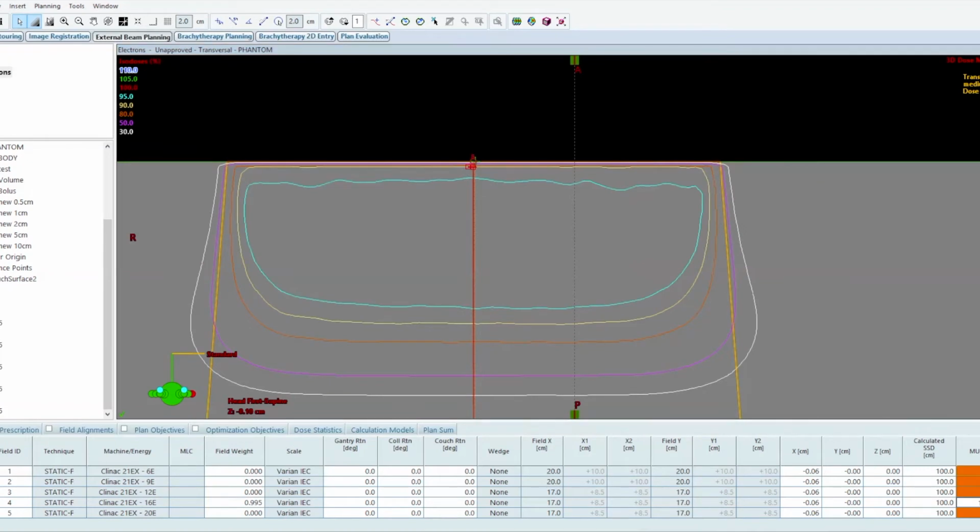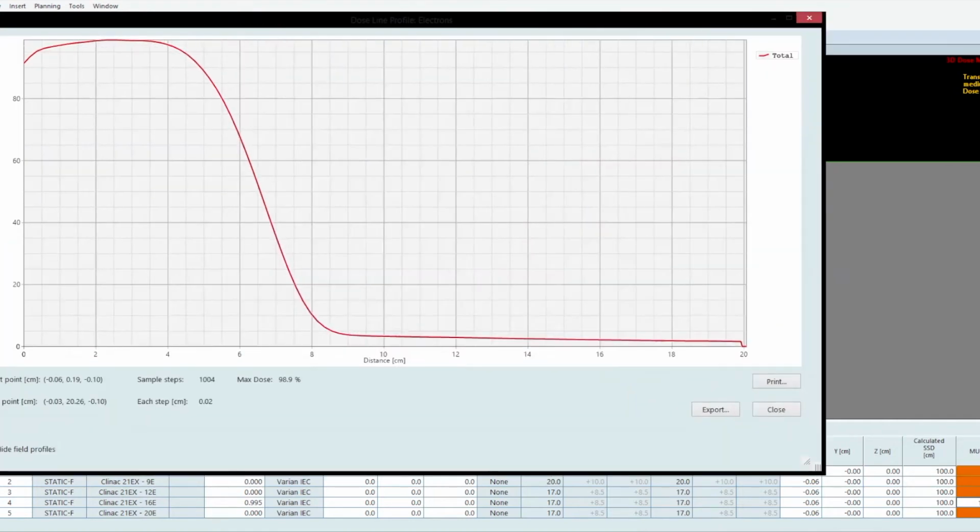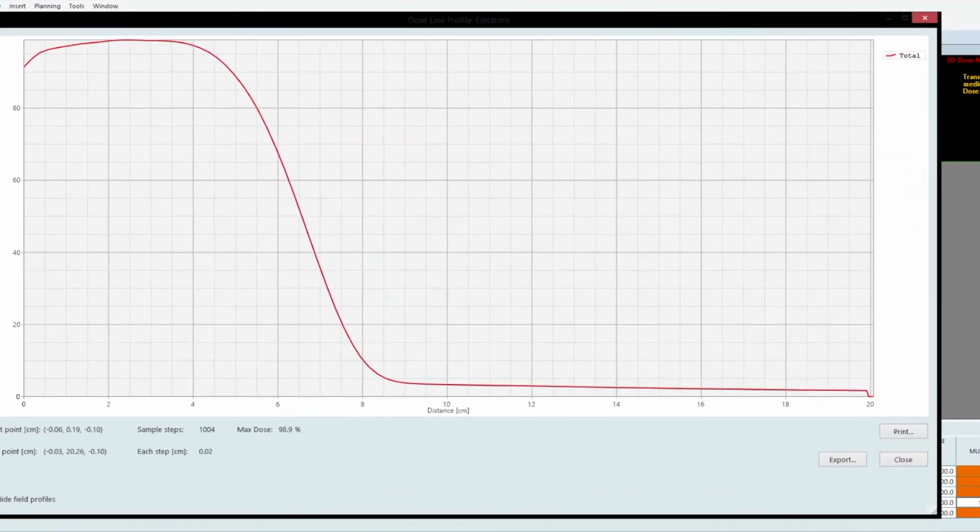And if we take a look at the profile, okay, now you can get a better picture of this broad plateau. So my surface dose, again, has increased 5-ish%. I'm at 91, 92. My Dmax, it's really hard to pinpoint Dmax now. It's a little bit of a range. So it can go probably anywhere from 2 centimeters to 3.5 centimeters. You know, it is roughly 100%, or a few tenths of a percent within there.